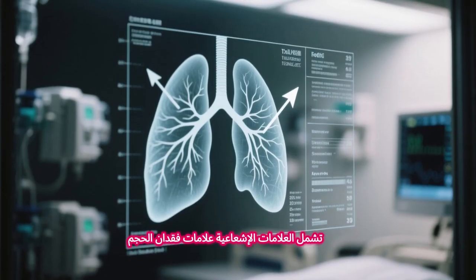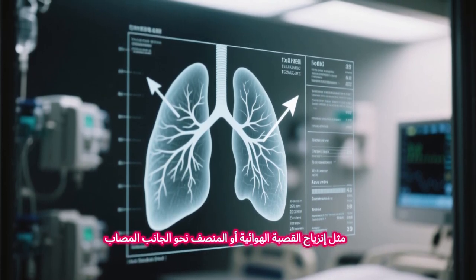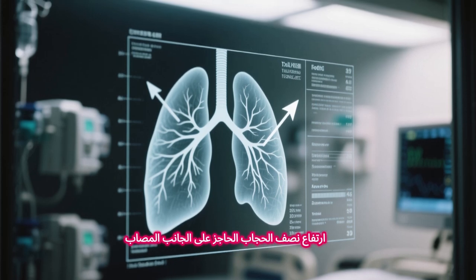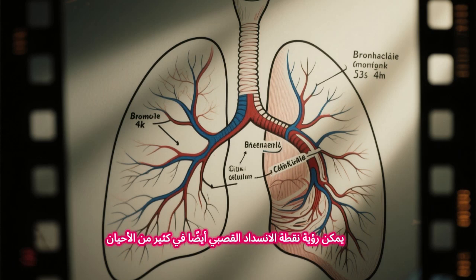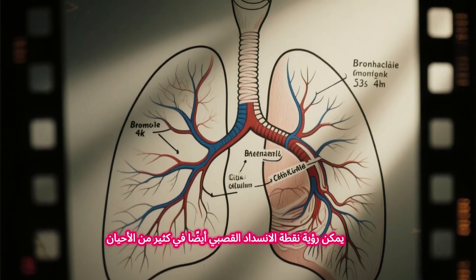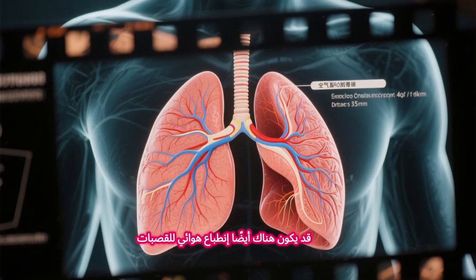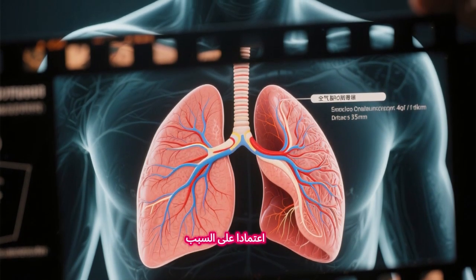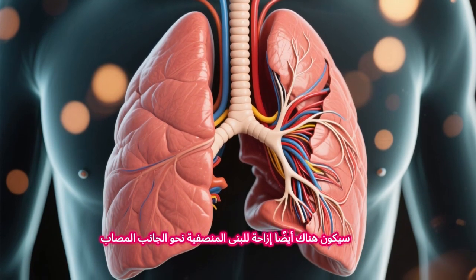Radiological signs include volume loss signs such as shift of the trachea or mediastinum toward the collapsed side, elevation of the hemidiaphragm on the affected side, and crowding of the ribs. The bronchial obstruction point can often be seen as well, showing a central mass or mucus plug. Air bronchograms may also be present, depending on the cause. There will also be displacement of the mediastinal structures toward the affected side.